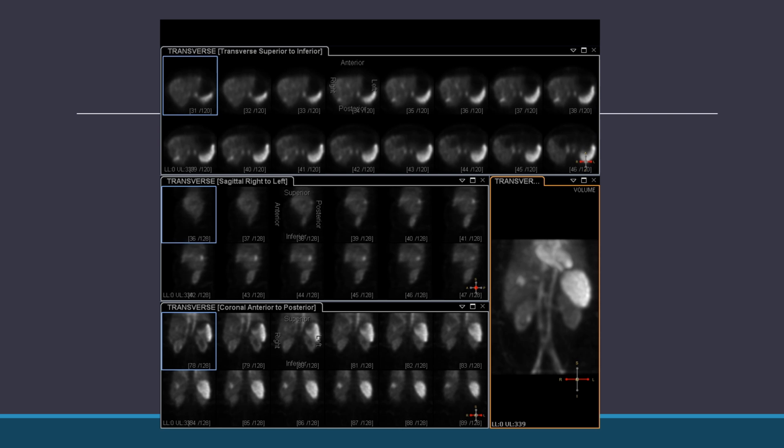And this is an example of a SPECT for hemangioma. You'll see over here on the summed images, you see the heart, you see the spleen, both kidneys. You'll see the outline of the liver real faintly with the hemangioma in the center. And then you see the major vessels of the abdomen, and then they bifurcate there to go down each leg. And so the top here is the transverse images. You see the hemangioma showing up with some blood pooling through there.